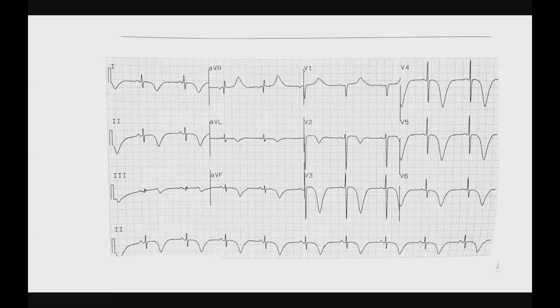Apart from that, other things that can be observed here are that there are T-wave inversions across all the V2, V3, V4, V5, V6, lead 1, lead 2, and lead 3, and a positive T-wave in aVR lead.